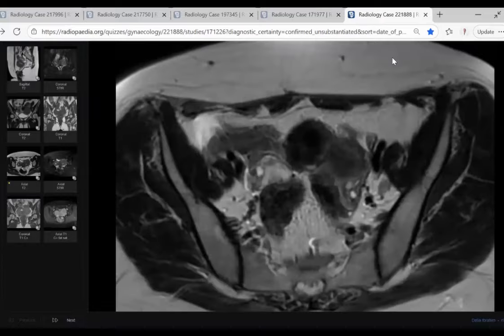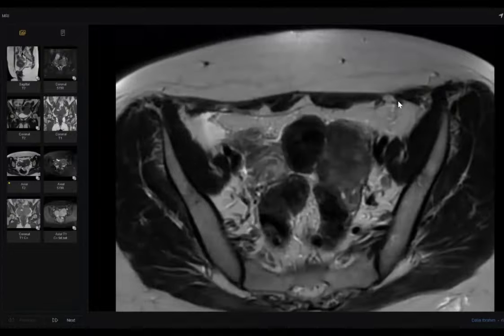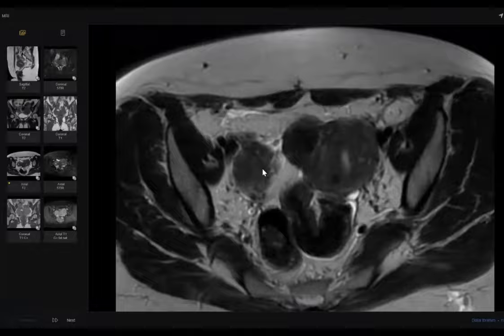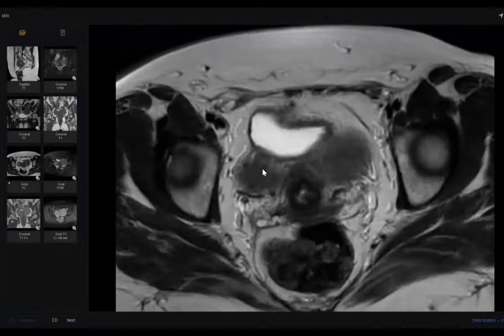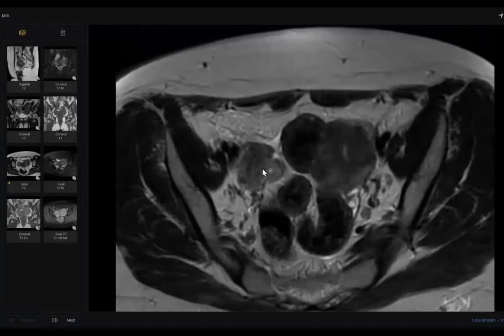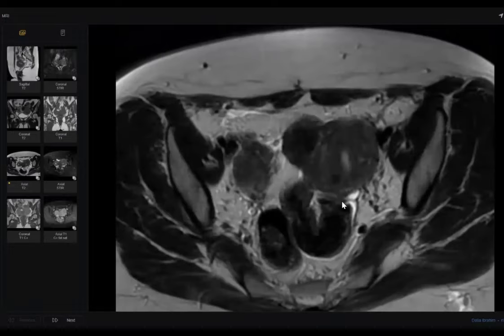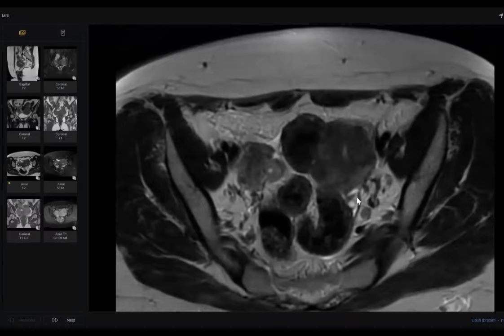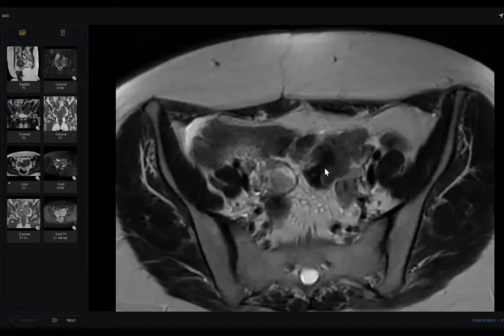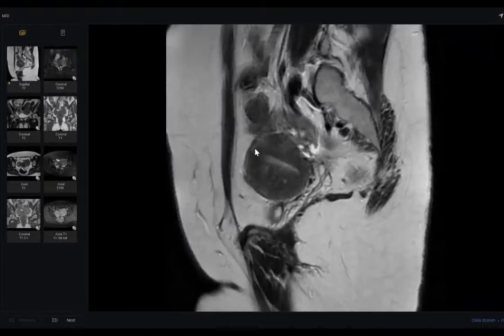One second, please. The left uterus appears normal. The ovary, sorry, and here is two. If it is adenomyosis, I'm trying to look for the spectrum of endometriosis. However, I cannot really appreciate it. Are there hyperintensities here? Or is this in the ovary? Are there any coronal sequences or more sequences I can examine, or even the sagittal again, in case there is anything extra I can catch?